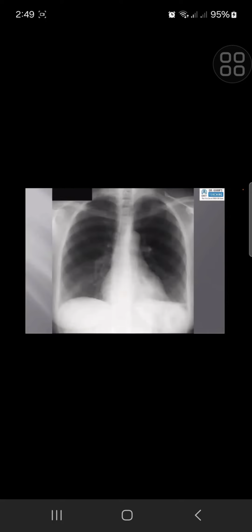Okay. I am presented with a lateral radiograph. In my usual practice, I would review the frontal radiograph first, if that's okay. Or should I carry on? Okay, that's okay.